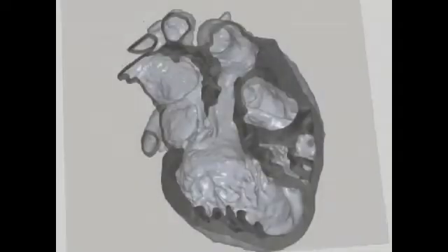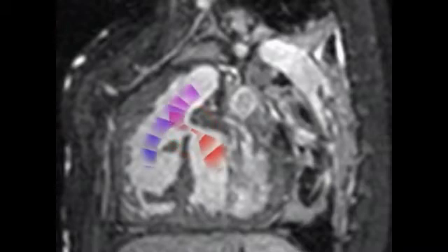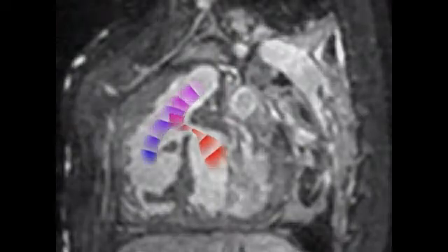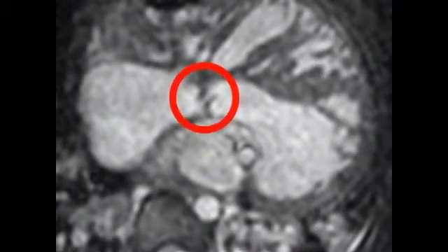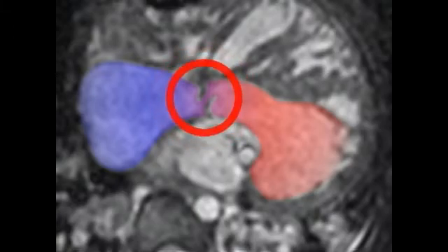This image shows a different cut through the heart. Again, we see the tunnel leading the blood from the left ventricle to the aorta. The MRI examination shows leakages at two positions in the tunnel. The bigger of the two septal defects is seen in this image. A second and smaller leakage was detected at another location, as shown by this MRI image.